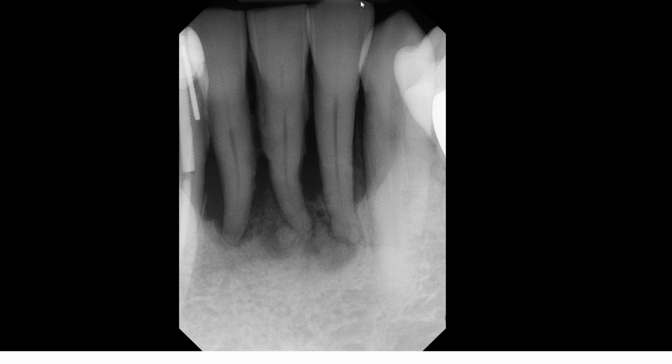I know we're just missing the incisal edge here, but I don't see any major signs of caries once again, both at the occlusal or incisal level, as well as the proximal surfaces. Yes, we do have a little bit of overlap, but overall, no sign of caries, and the patient is asymptomatic.